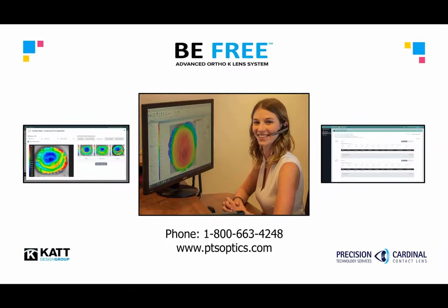The BeFree software makes the orthokeratology fit optimization process fast, efficient, and accurate whether you are an experienced or neophyte orthokeratologist. But if you have questions along the way, the Precision and Cardinal consultants are here to support you. Let us know if we can help.